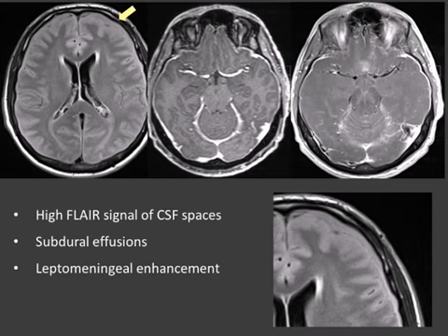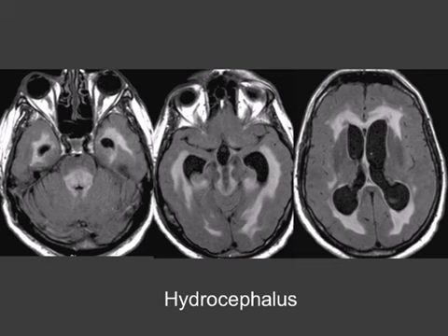If you do just a normal T1 with contrast, you might not see anything like this one. So you better do something with fat suppression or magnetization transfer contrast. You have to increase your contrast. Then you might see leptomeningeal enhancement, especially in the vermis region. So next time, if somebody is asking if there is leptomeningeal enhancement in the case of meningitis, go right there and look at the vermis region if you see an enhancement. If you see hydrocephalus like this, and the patient is having worst headache of life and the whole clinical picture, then again, you don't see really meningeal enhancement, but you will suggest meningitis.